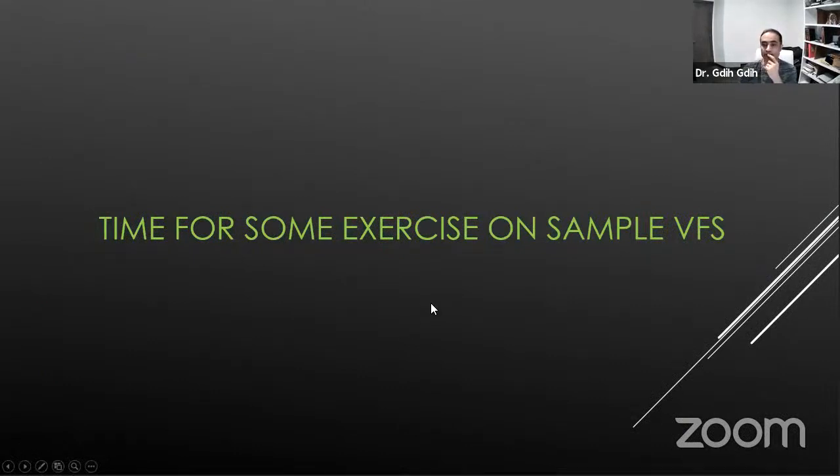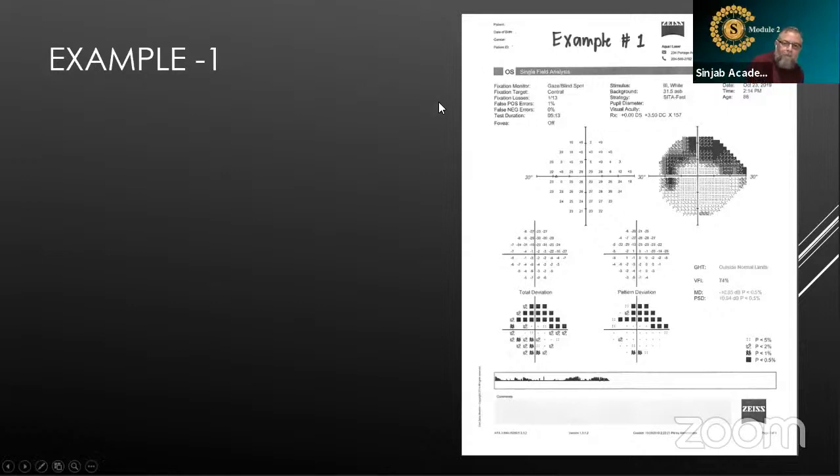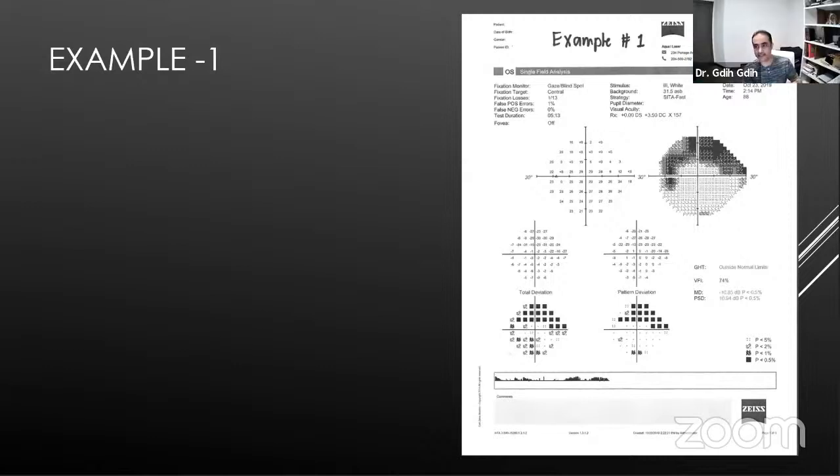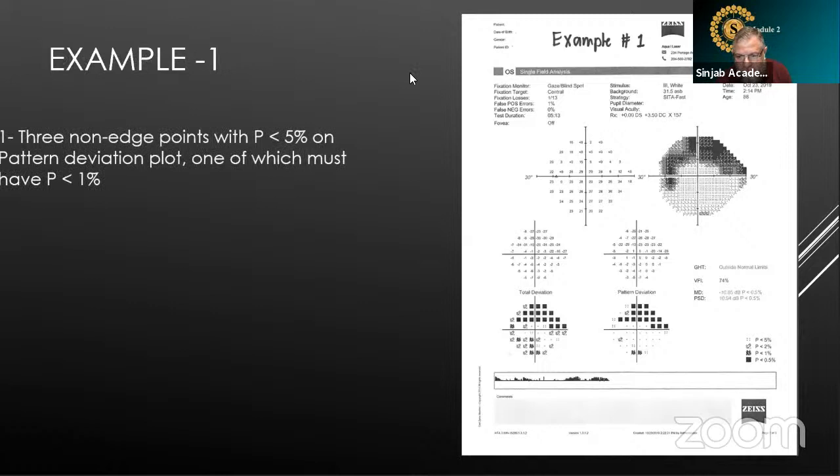Okay, let's pull example number 1. Do you want to take it, Dr. Mazen? Yeah. Actually, yes, it is, because we have 3 adjacent points, non-edge.